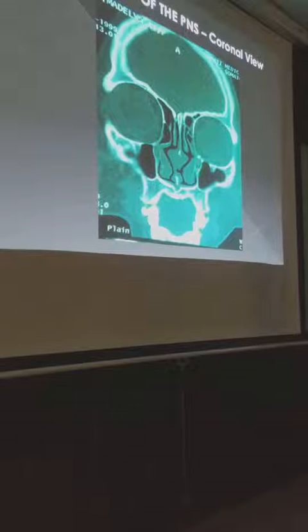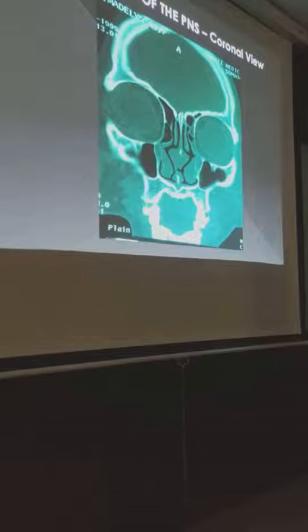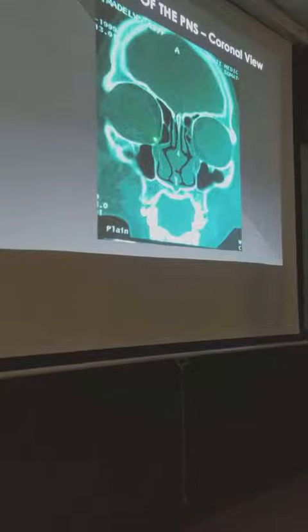You can see here very clearly your nasolacrimal duct is still trying to drain there. Okay? In the Hasner's valve, protected with the Hasner's valve in the inferior meatus. Okay? So that should still be your frontal recess. Okay? Next slide.